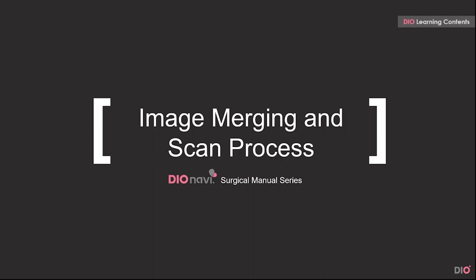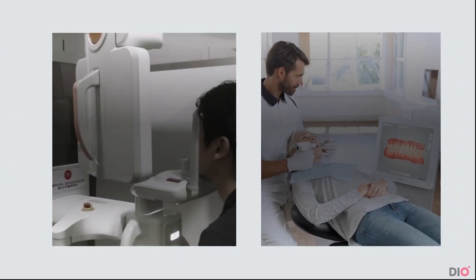This is the third lecture of the DioNavi Surgical Manual series, the Image Merging and Scan Process. Let's start. To produce the DioNavi Surgical Guide, both CBCT and oral scan data are required. There was an analog surgical guide that was used before, but it was produced by taking a CT twice. And now, most digital surgical guides require oral scan data as well as CT data.